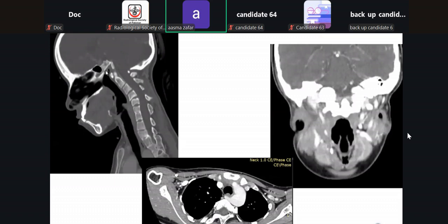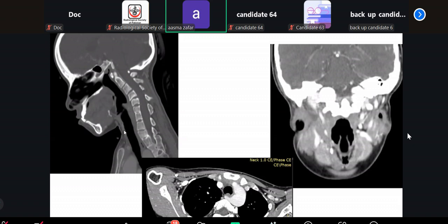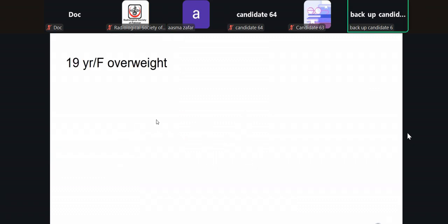When a patient has, look at this, the clivus, the platybasia, and no vessel arises from the medial side of the aorta, this was anomalous origin of the right subclavian artery, posterior to the trachea. So this was Klippel-Feil anomaly, and when a patient has one congenital anomaly, there are others as well. She had atretic ears, this anomalous vessel, and then look at the fused vertebrae and the posterior elements. Great. So this was fine.